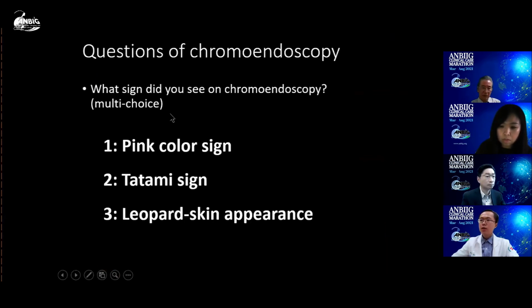So this is my next question. What signs did you see on this chromoendoscopy with Lugol solution? And this is a multiple-choice question.